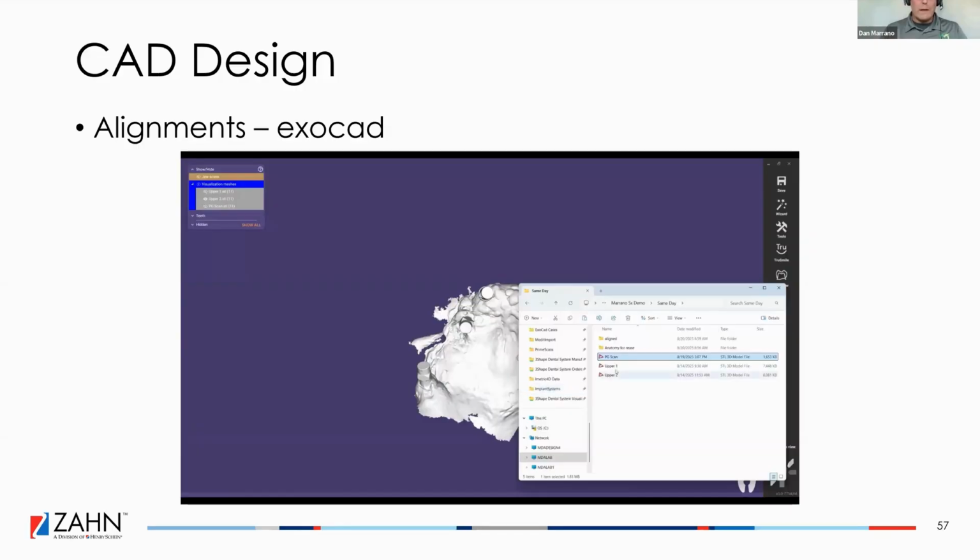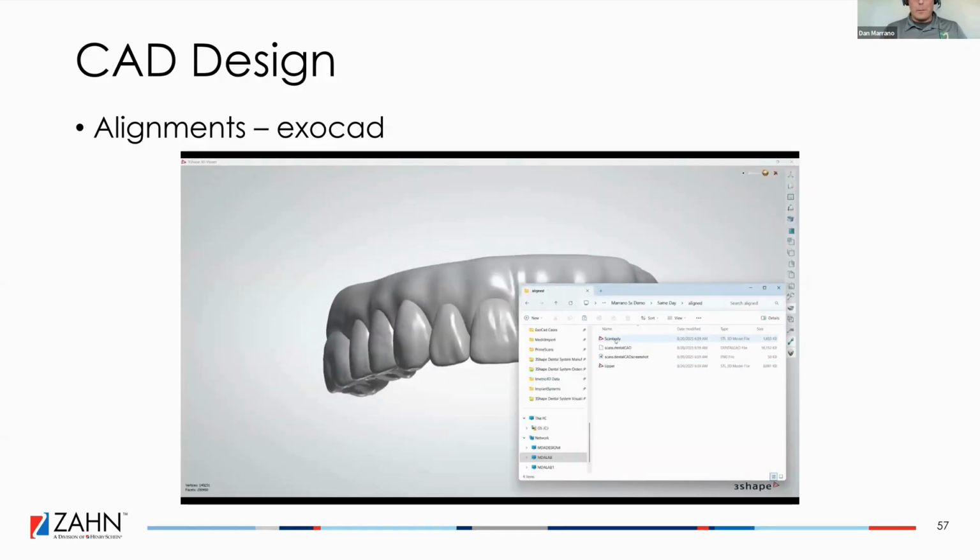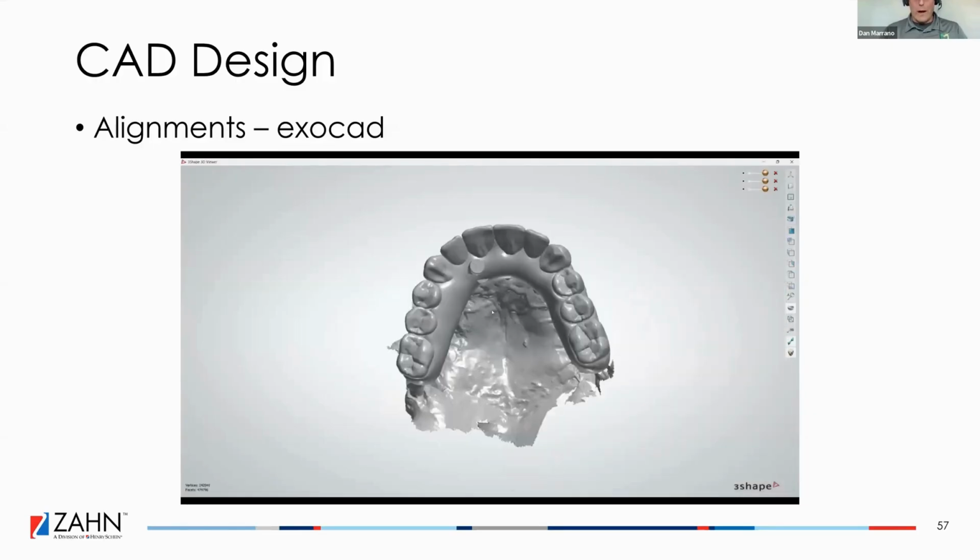We only need 2. We need the tissue scan and the photogrammetry scan. And there's our wax up we saved, and there's our alignment. And we're ready now to roll to the digital conversion. It's just thinking of what you would normally do in analog world as a denture conversion. We're now doing it digitally.